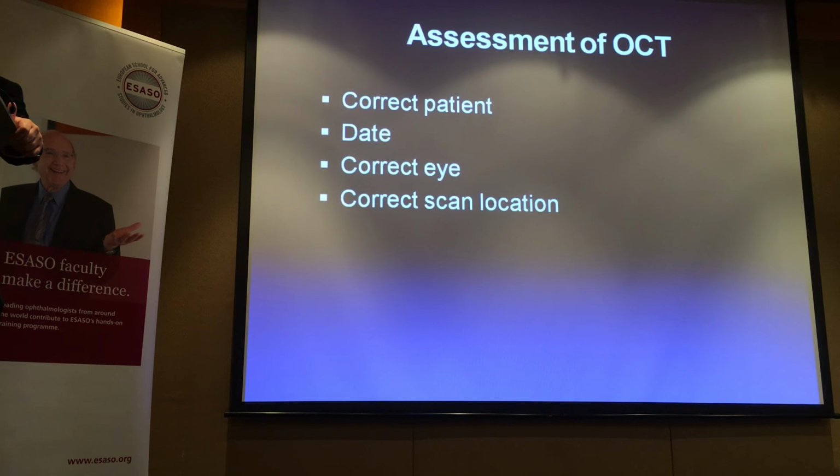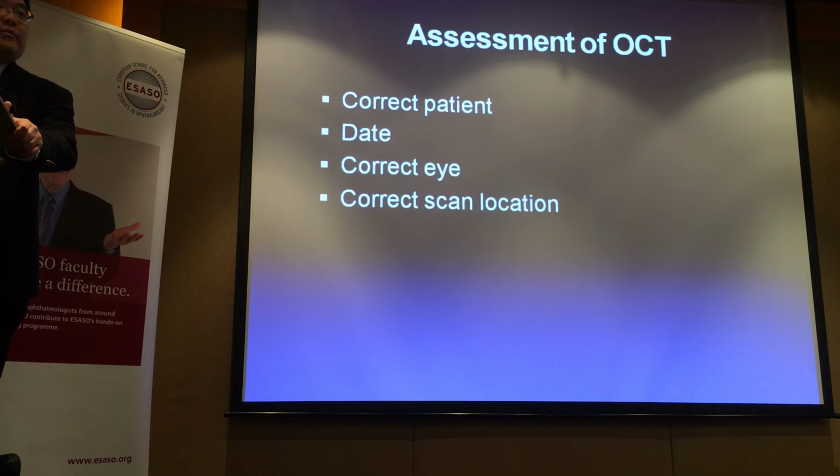The correct scan location is important as well. You assume focus on the macula. Sometimes patients may not cooperate, or the patient may look to the other side for some other reason. So you have to make sure you know where you're looking at.